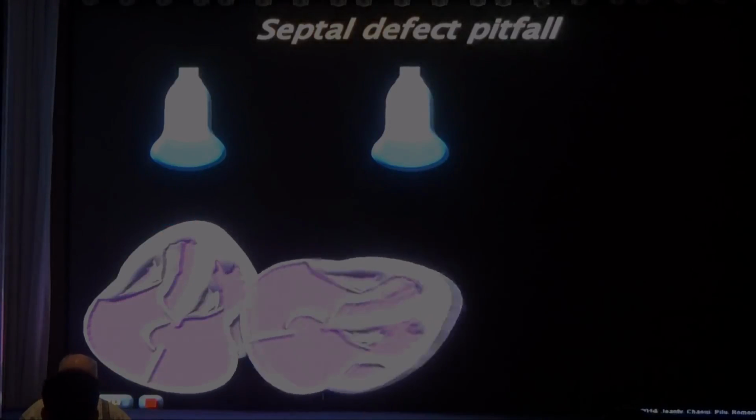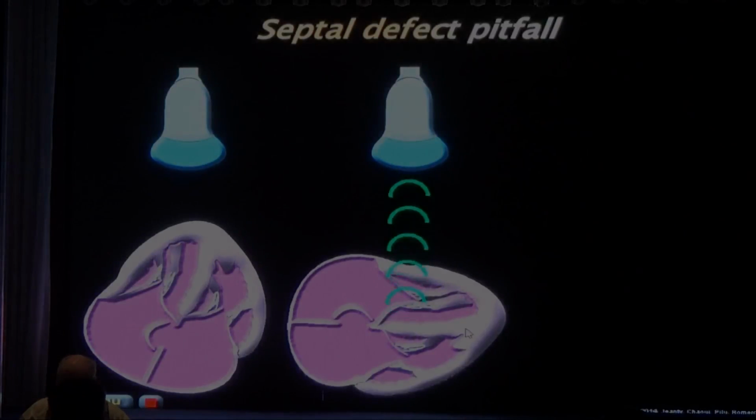If you look at ventricular septal defect, and you look in an apical view, which is what we often use when we do fetal echo, the interventricular wall is going to be almost parallel to the ultrasound beam. And if the beam is parallel, it has no interface to reflect on. So the machine will have no signal to write, and the machine will write a drop-out artifact. It will put a black hole that looks like a ventricular septal defect. So avoid doing an apical view, go instead in a transcostal view, and now you are perpendicular to the interventricular septum. And then you have a good reflector.